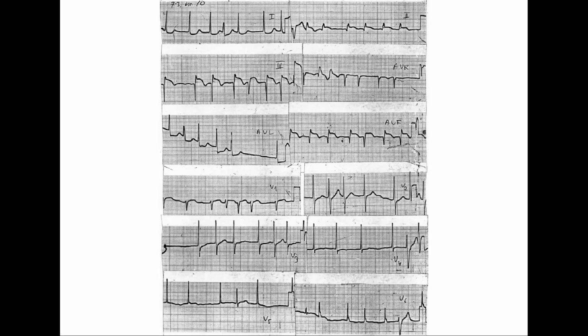No, that's an impulse formation abnormality. And which one? This was the first that we started with. Arrhythmia, no P wave. It has to be an atrial fibrillation. Please remember, arrhythmia, no P wave: immediately you should diagnose an atrial fibrillation. So this patient had an atrial fibrillation. You don't need to talk about the P wave, the PR interval.